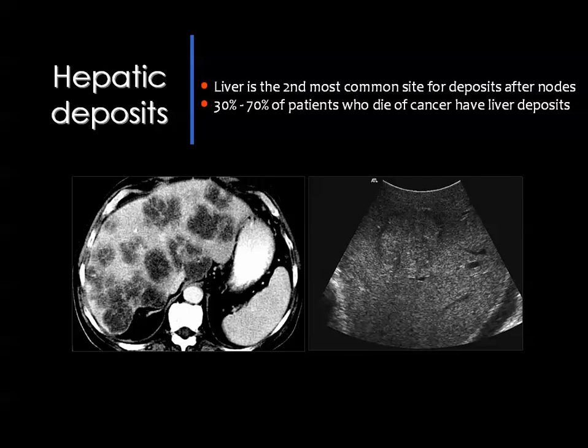You know that hepatocellular carcinoma can be multiple, lymphoma can be multiple, metastasis can be multiple. But in order to separate those entities, you know that hepatocellular carcinoma has an intimate relation to liver cirrhosis, but lymphoma and metastasis do not have this relation with cirrhosis. Then one of the suggested criteria of metastasis is to identify that the liver is not cirrhotic. This is the first issue.